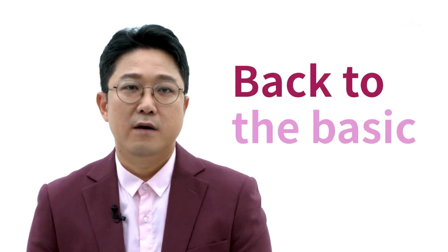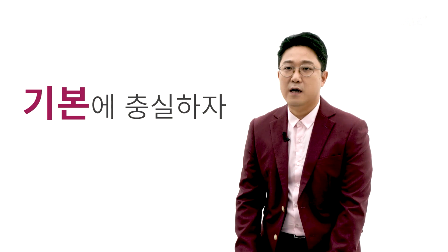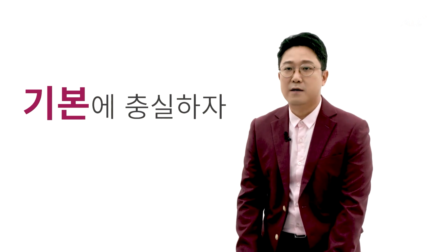A lot of people talk about back to basics. I think sticking to the basics is very important.